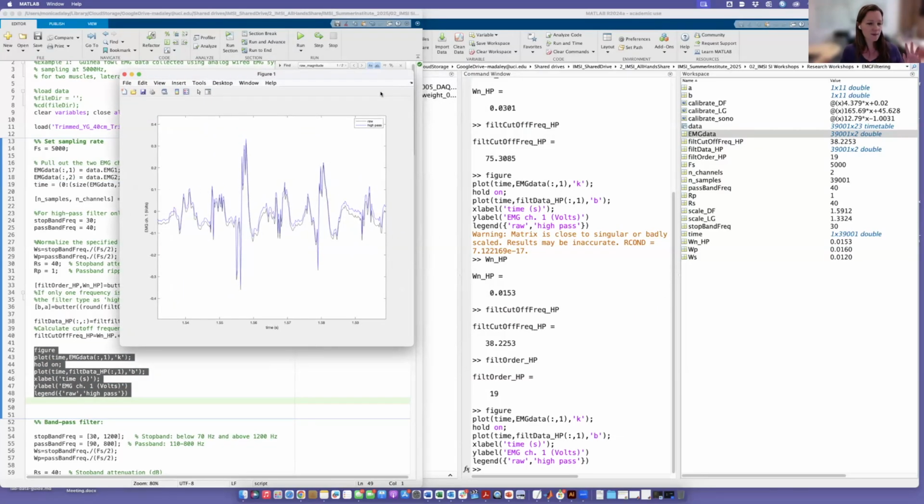I wish I had a bad example to show you, but where you typically see the most obvious problems is when a signal, rather than going symmetrically above and below 0, goes from 0 to a sharp peak and then back to 0. In your filtered data, if you are using a high order filter, you will see it go below 0 and then up again.